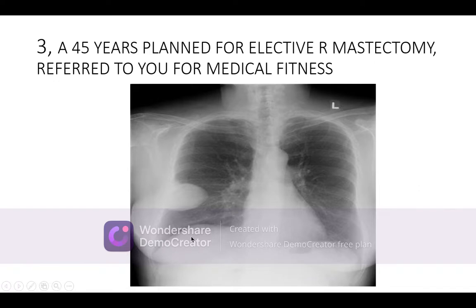One of the candidates previously said that it is a secondary within the lung from this side. No, because the border is very regular. It is a homogeneous type of opacity. It is least likely, and there is no secondary effect of this on this side, or the surrounding side. So the management is, of course, there is no management if it is a benign type of opacity.